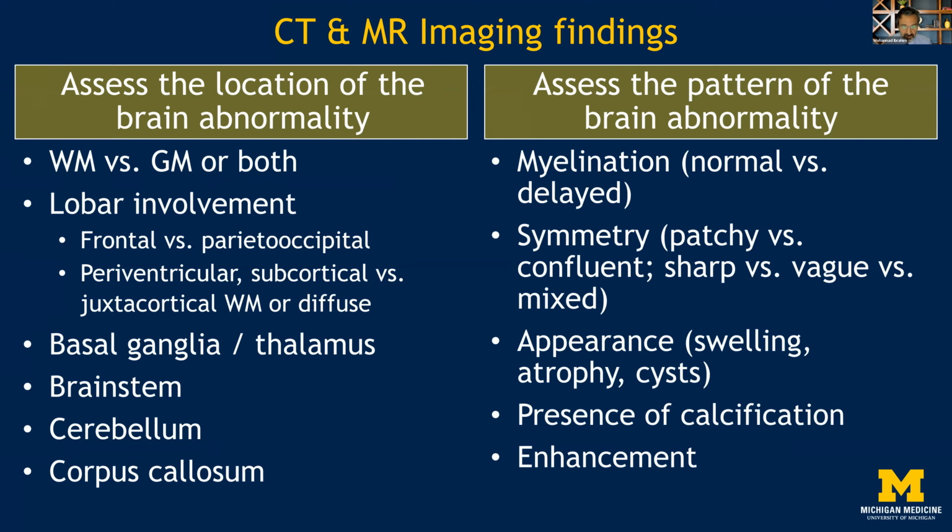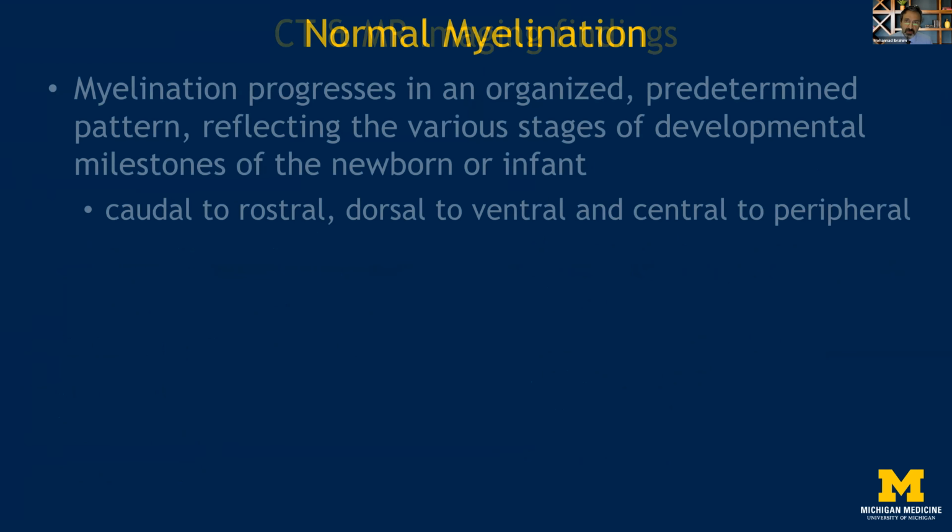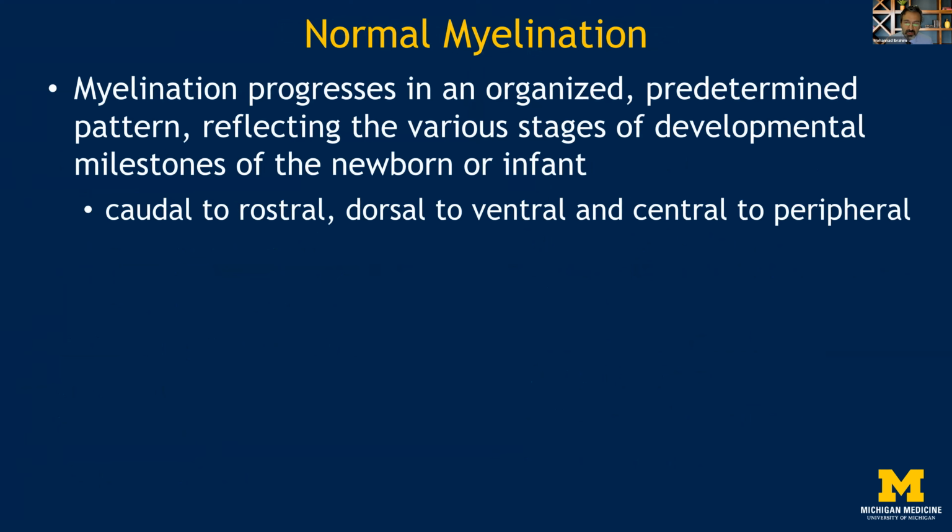Presence of calcifications is very important. We can clearly see them on MRI, but CT scan is way easier to assess for the presence of calcification. However, susceptibility weighted images can help us in this characterization and assess for the presence of calcification or hemorrhages. Generally, we give contrast material, and it can help to narrow the differential diagnosis, as we will see in some of the coming examples.